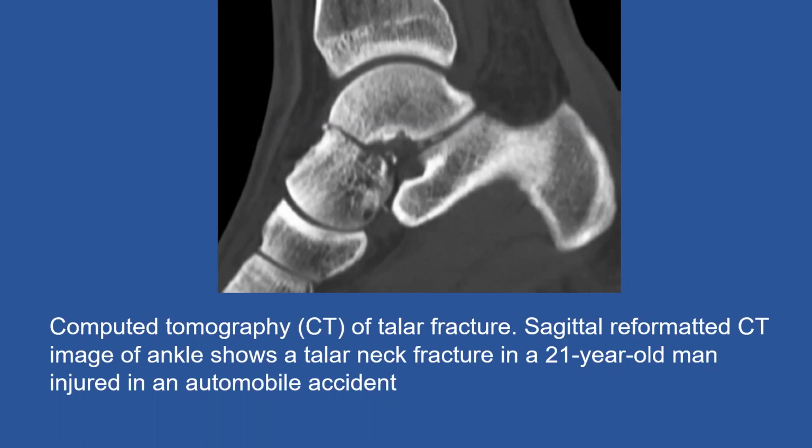We know that Hawkins himself described the avoidance of avascular necrosis on plain X-rays. You have to know both on plain X-rays. If on plain X-ray, after some time, you see that there's significant osteoporosis of the dome of the talus, this would tell you that this is a viable dome. Okay, keep this in mind. X-ray can be used in certain ways. CT scan can be used in certain ways.